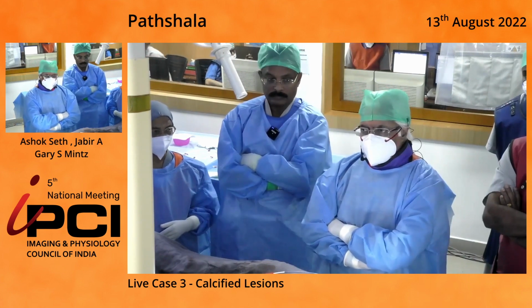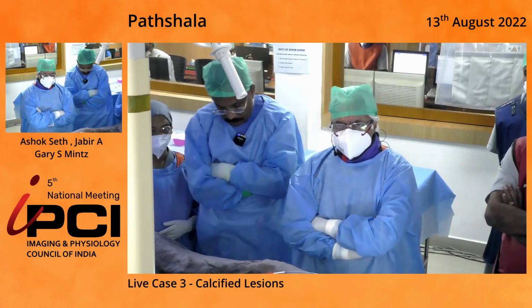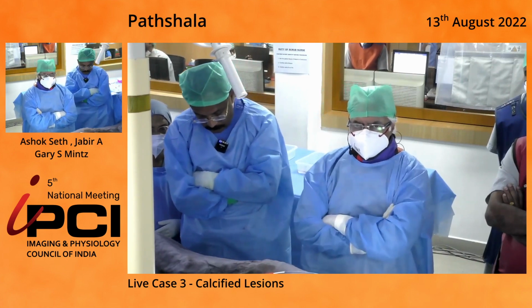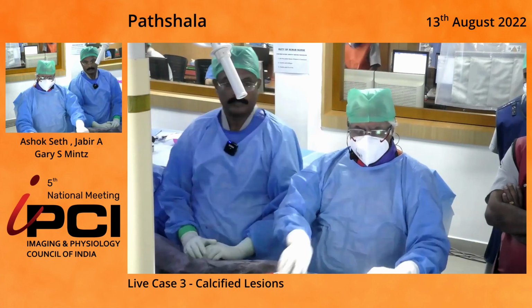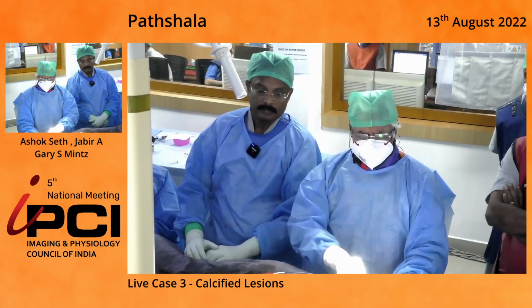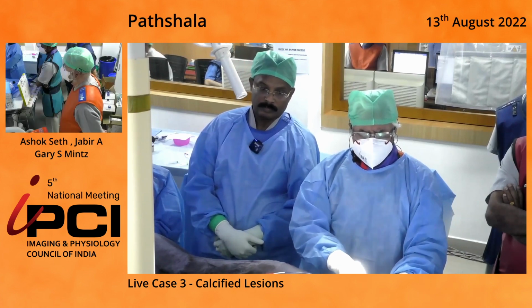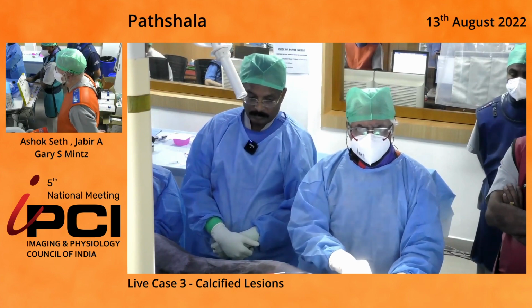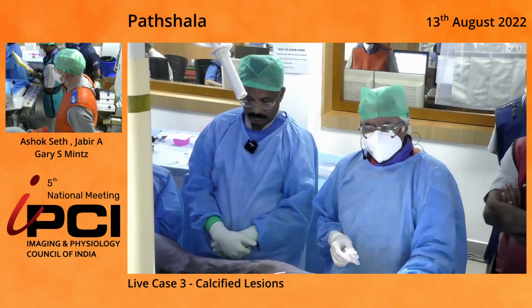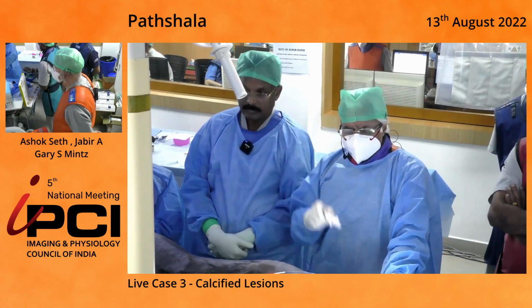No, the overlap is the 2 layers of stent. And that's where, should we say, the underexpansion is. And that's where recurrent thrombosis is. I had stated right up front that there's no hypercoagulable state. That's very reasonable thought. Drug compliance is another reasonable thought. Was she compliant? All that has been looked into, and we're really faced with what is right in front of us, which is an underexpanded stent.